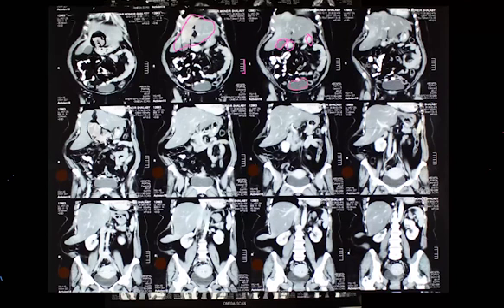Is this a man or woman? Why did you identify her as a woman and not a man? What organ does she have that made you say so? Identify the uterus. Point to the uterus. Absolutely. Of course, the kidneys are there. The psoas muscles. Where are the psoas muscles?